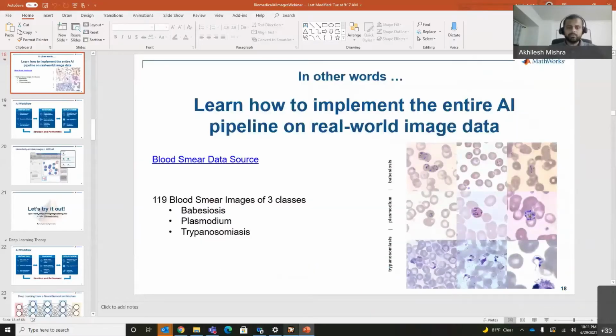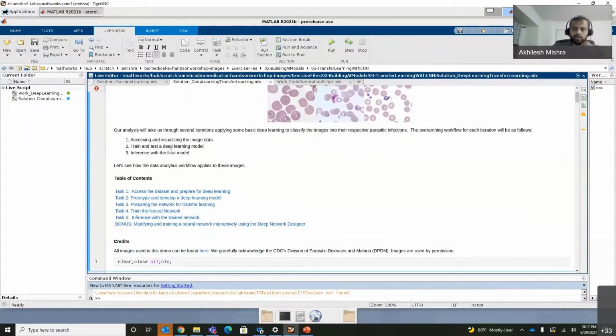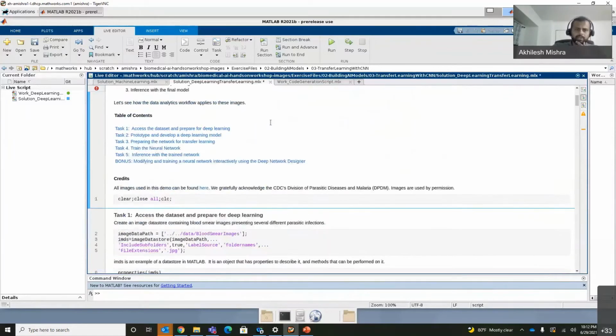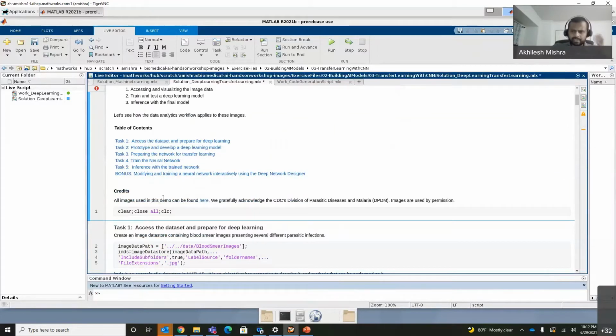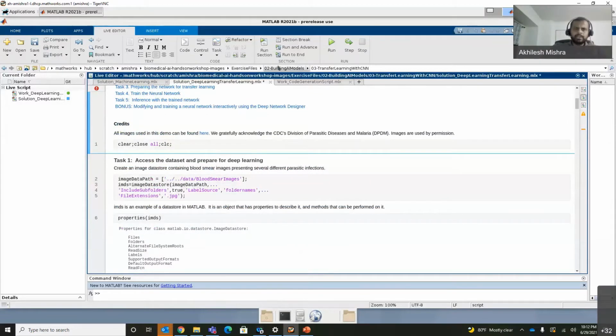So with that, I will jump to MATLAB right now, and let's go over this example in a live demo. Let's start with the deep learning approach first. And as we go along, I will talk through subtle points with you. So let me just start. By the way, this is my MATLAB instance. I have opened a live script, which has code as well as text for the scripts, describing what's going on. I will be running one section at a time and talking about it in a little bit of detail. So the first step I would like to point out is the data I have over here is in this folder, which is the data folder.